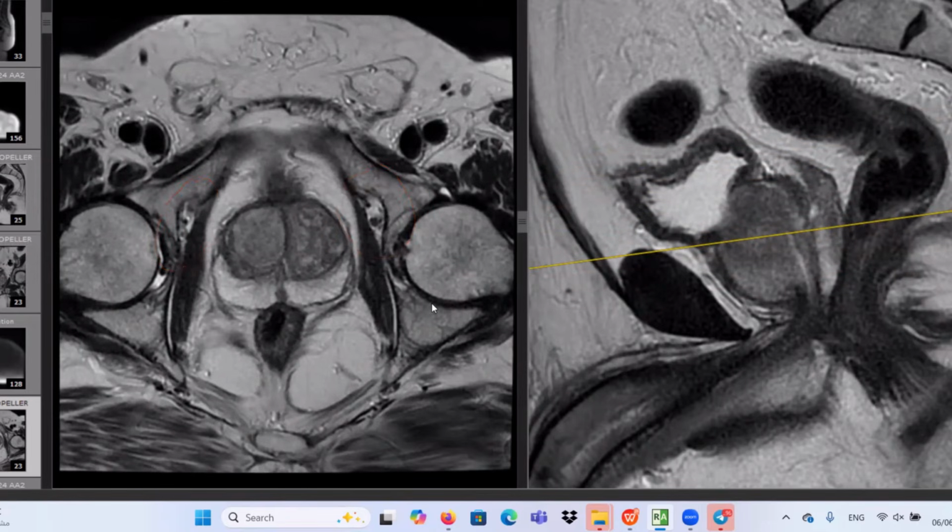But take care, once we have inguinal lymph node enlargement or common iliac, pre-aortic, retroperitoneal lymph node enlargement, those lymph node groups are considered as metastatic lesions, M1, in the staging of prostate cancer.